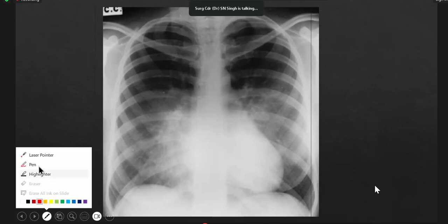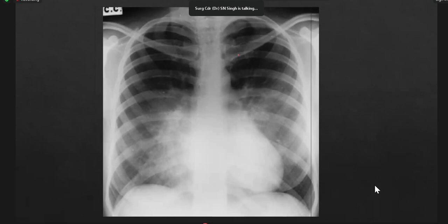So if you see the 7 sign, I know it is becoming very easy for me to show everything to you, but it is difficult. This is the number 7. And why it is so, I will disclose. This is the number 7. So if it is steeply turned anterior ribs, not the posterior ones, anterior ribs, then you should think of pectus excavatum. Okay. Fine. Yes, sir.